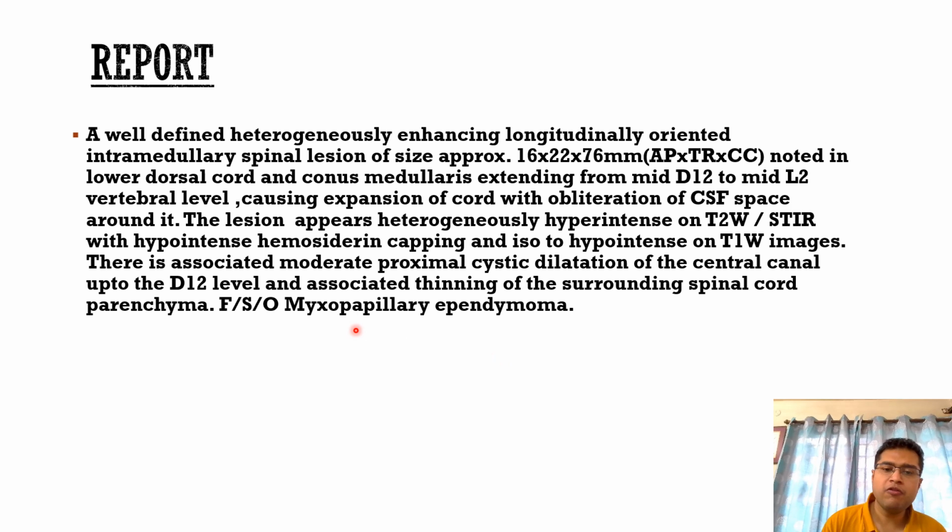So it was suggestive of a myxopapillary ependymoma because of the location, particularly occupying the conus medullaris, and a lot of hemorrhages that were seen within the lesion, and because of the heterointense signal on T2 weighted images. The lesion also showed a T2 hypointense cap, and myxopapillary ependymoma is very prone to hemorrhages.